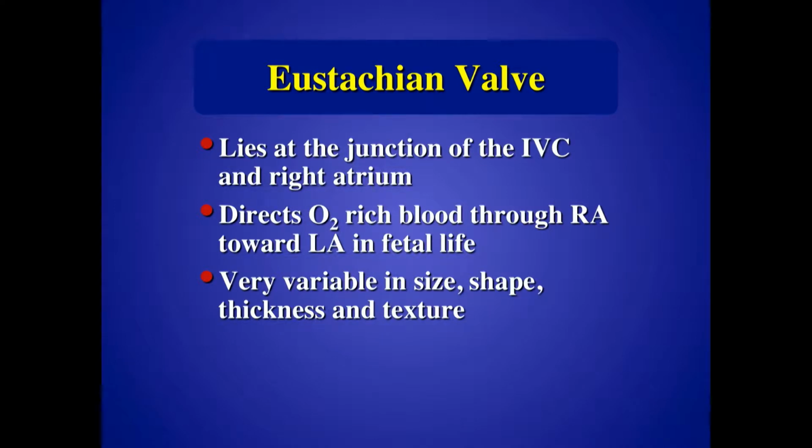So it's interesting, that case that I just showed was the first time I really found one, and now if you look for it, you can see smaller remnants if you pay attention to that area.